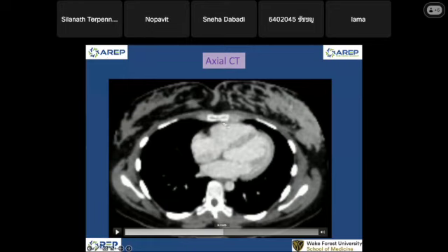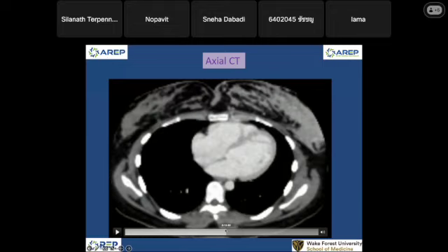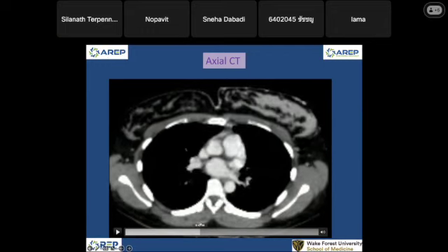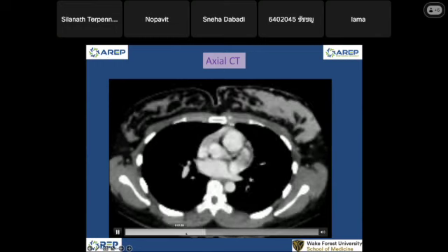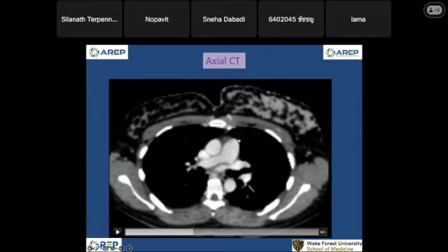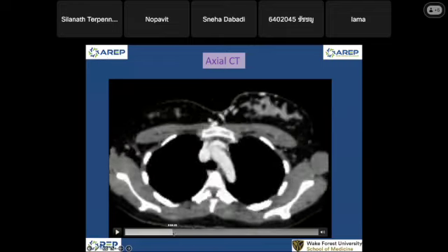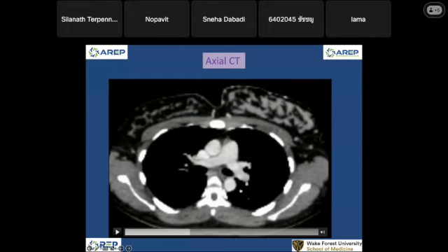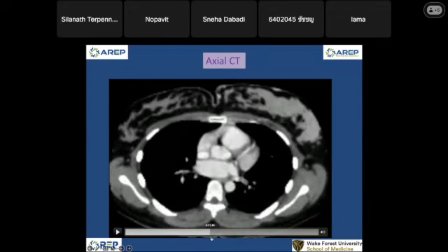You can see how close the right ventricle is to the sternum. After that is the right ventricle. The right ventricle will go out to the lung, become the pulmonary artery. Okay, this is a pulmonary artery, coming out from the right ventricle, becoming the right main pulmonary artery and left main pulmonary artery here. And then after gas exchange, it becomes oxygenated blood and will come back into the pulmonary vein.